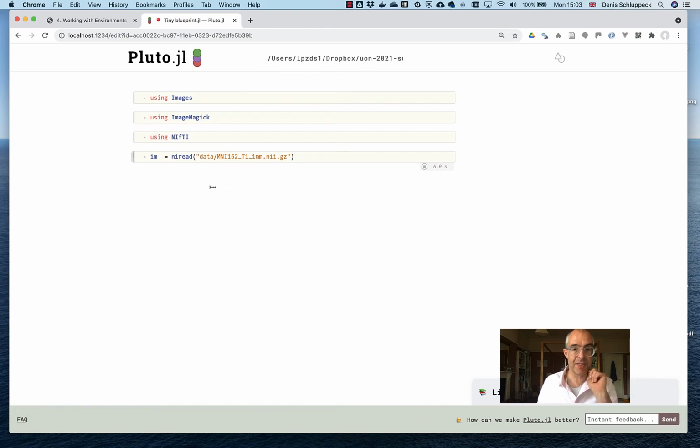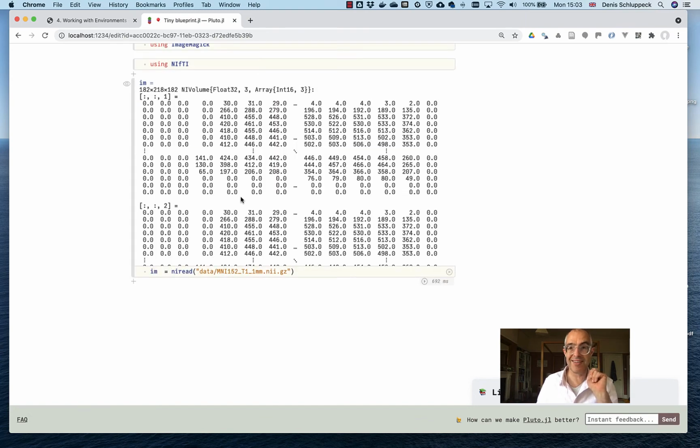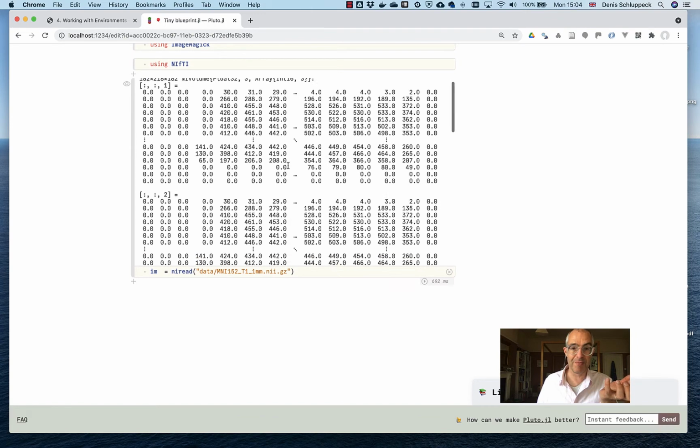And when it comes in, you will actually see what the data that makes the image actually is. It's a bunch of numbers, and we'll talk much more about how the data is actually organized and how it sort of refers to an image. But for now, you can just think of any image as a big table of numbers with lots of rows and columns and so on. So this is not very nice to look at, right? Because you can't actually interpret what all of those numbers mean.